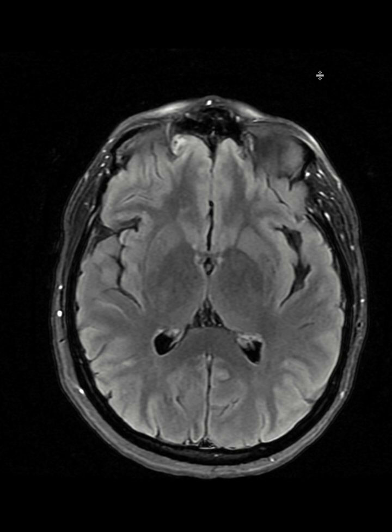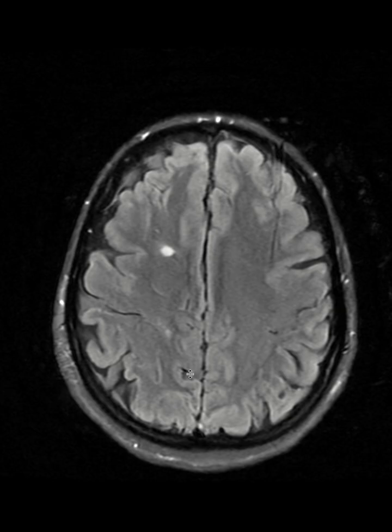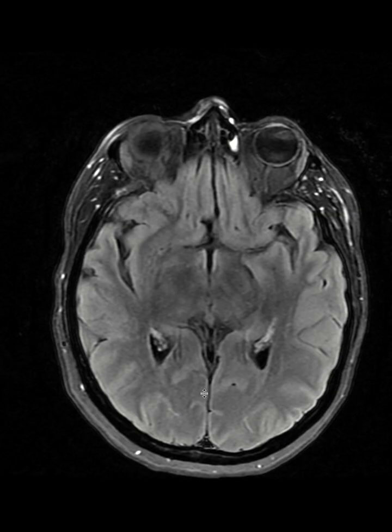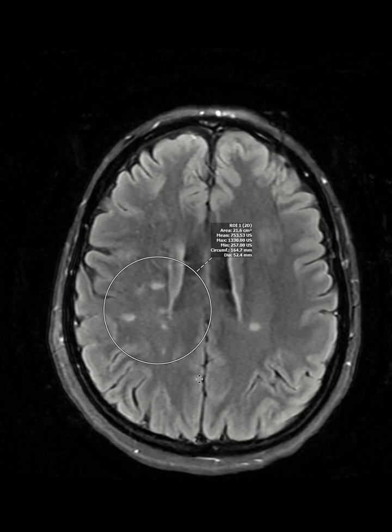You might see some lesions in the frontal lobe, in a subcortical distribution, very few, maybe 1 or 2 in a patient in their 40s. You're not going to see these extensive abnormal white matter lesions. And when you see these features, you should flag and alert the clinician or referring physician, which sometimes might be a primary care physician, that this is not something that you are going to see in headache. This is something beyond. It can be multiple sclerosis.